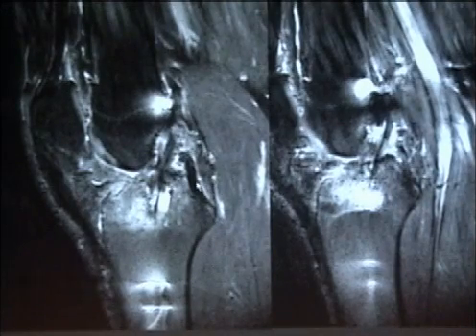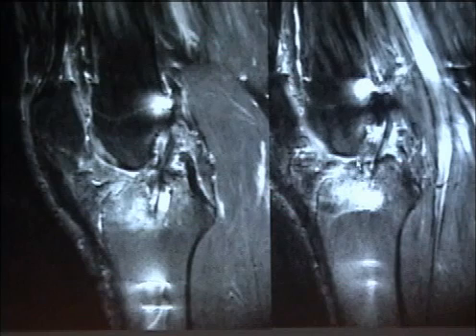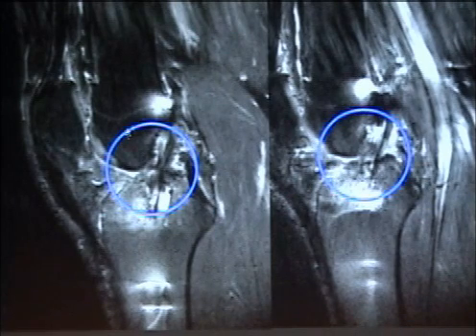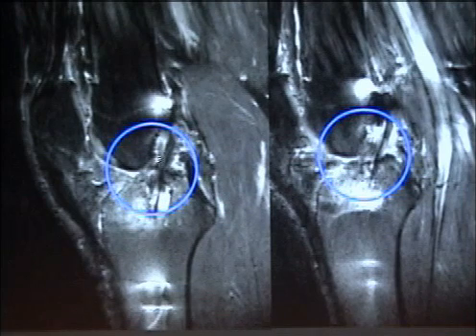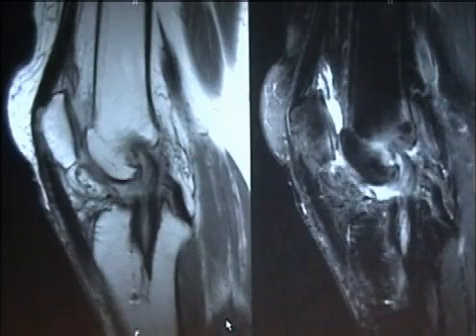Okay, so here in this patient, if you look, there's a problem here with the graft. The graft is being impinged by this osteophyte here and by this bone here, okay? That's causing impingement on this graft in that area. That's the cause of the patient's problems. There's abnormal signal in the graft. The graft is not discontinuous at this point. It's not disrupted, but there's abnormal signal in it. It's being impinged by this bone in this area, and this needs to be corrected with a notchplasty.